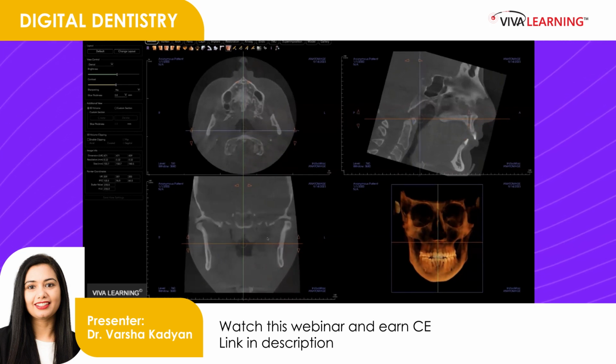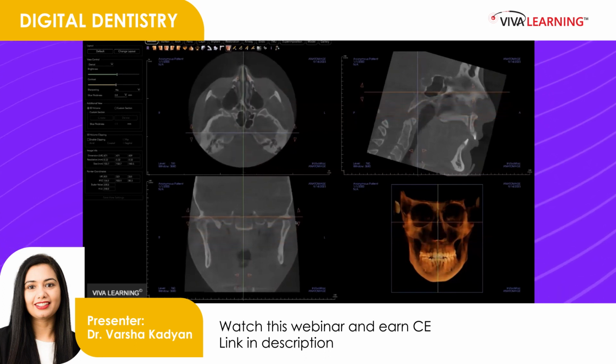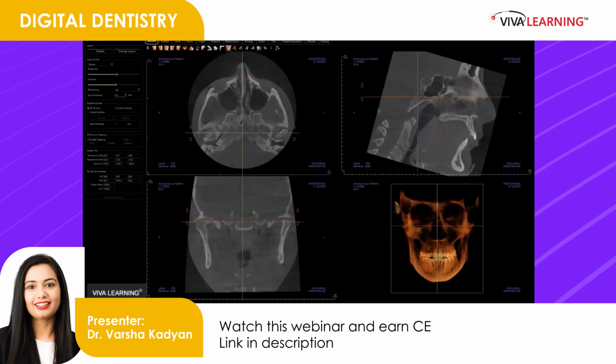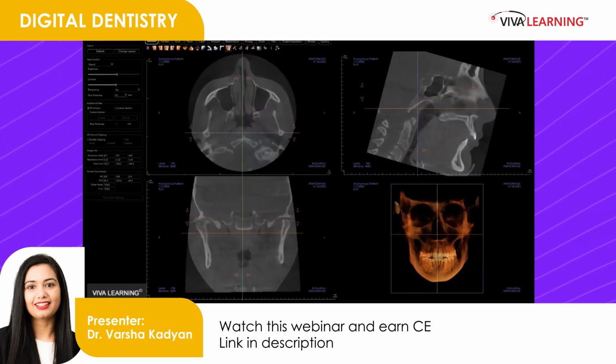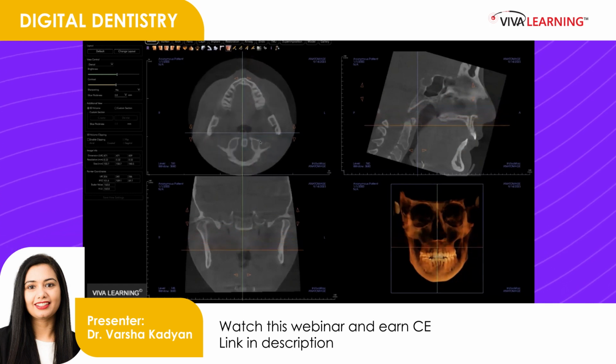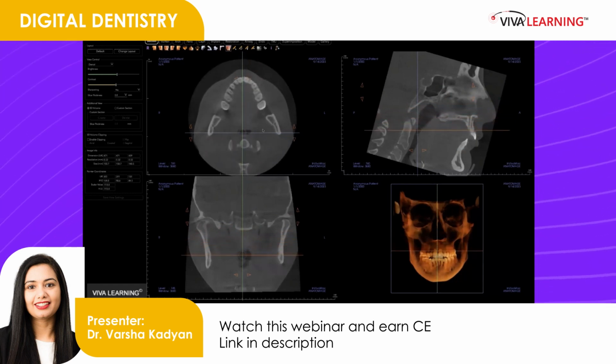And again, reorienting the coronal view like this, I know that my scan is symmetric and I can readjust the patient positioning. So this is a good way to start reviewing your CBCT scan.